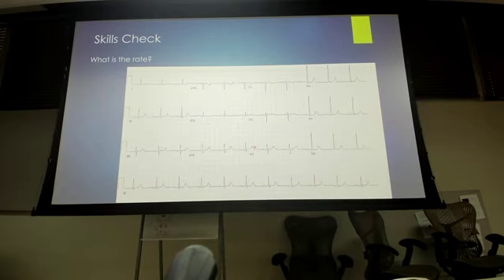All right, fine. What if we had to do the counting method? What's your thoughts on the counting method? So then I can do the first one, so 300, 150, 100, 75, so between 75 and 50. 60, right? All right, so close enough.